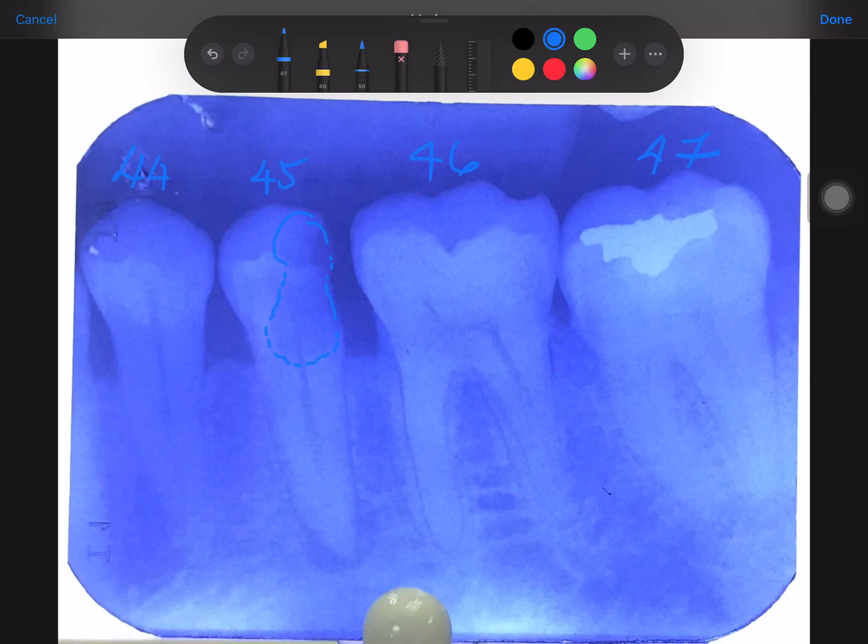Very good. Then when we come to the root, there's radiolucency at the back. There's radiopacity also. Where do we see the opacity? Are you talking about this one? That must be just a little bit of excessive amount of bone over here, right?